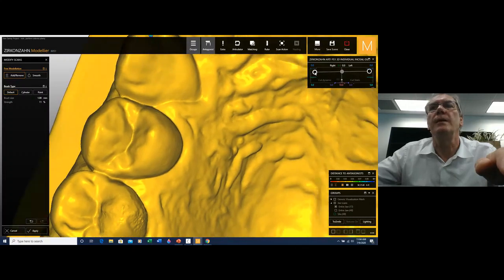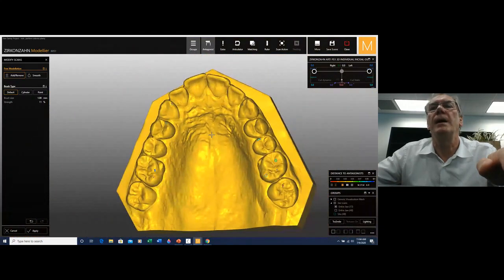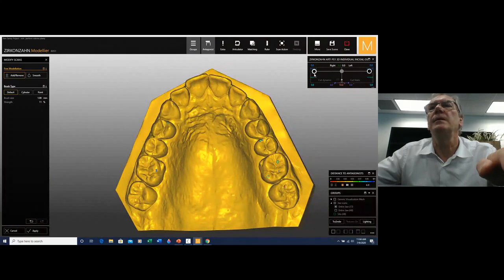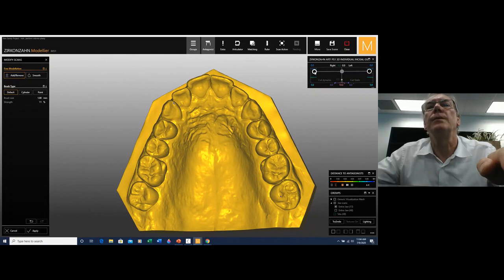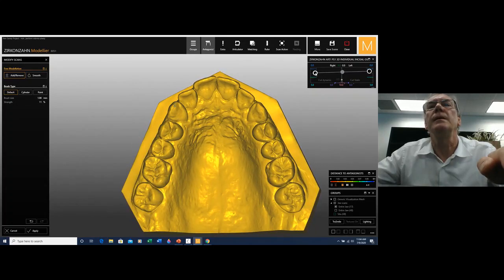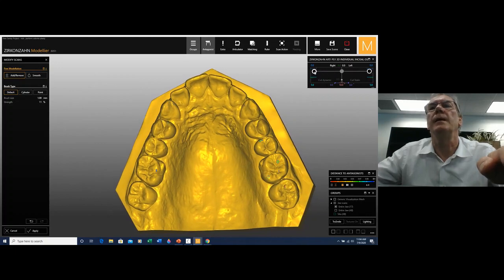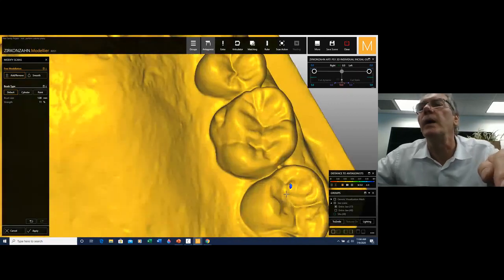There you are. We're through now with the movement. Let me just open it up wide so we can check everything out. 1, and they are all gone. 2, 3, 4, and we are taking the complete load on the canine. I'm happy with that at the moment. Check the other side quickly. I remember a contact pitched up here, so let me take this one away.